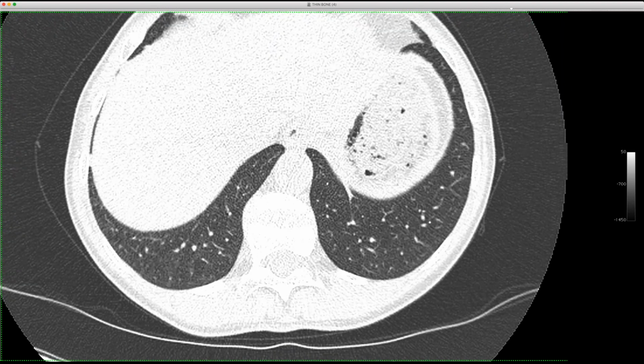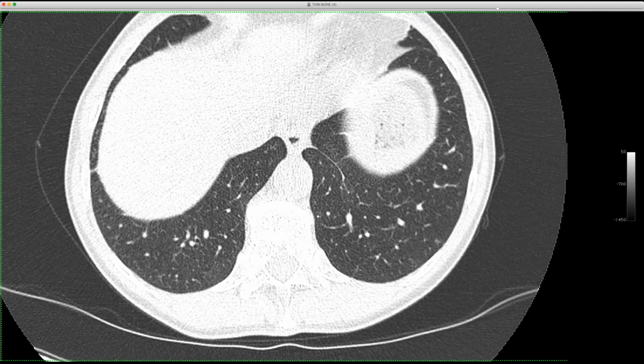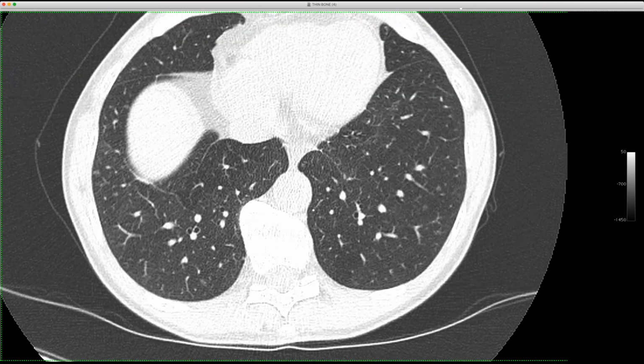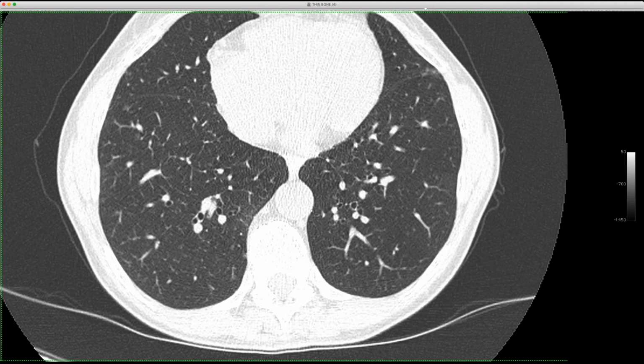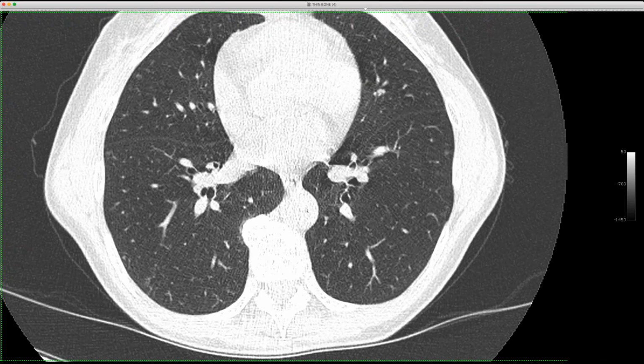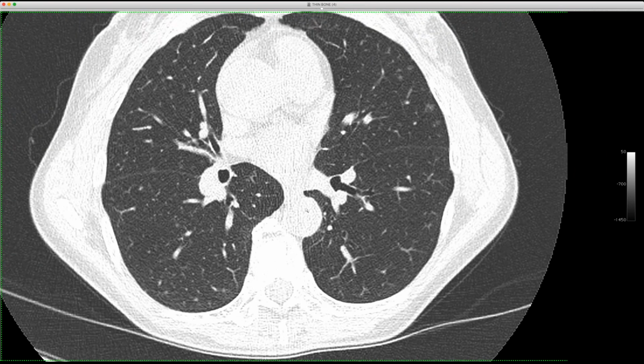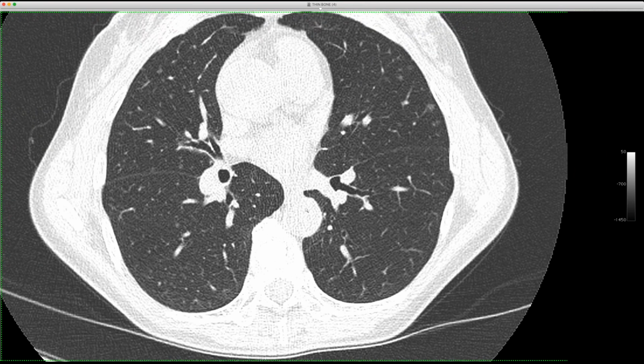Not particularly attenuating. They're all pretty much ground glass attenuating, but they have very discrete walls, and she's asymptomatic, has no underlying disease. I had seen a couple cases of this before, of presumptively what this is. I showed it to two of my colleagues who both came up with the same thing without me biasing them. I don't know if anybody else has seen something like this, what they think this might be.